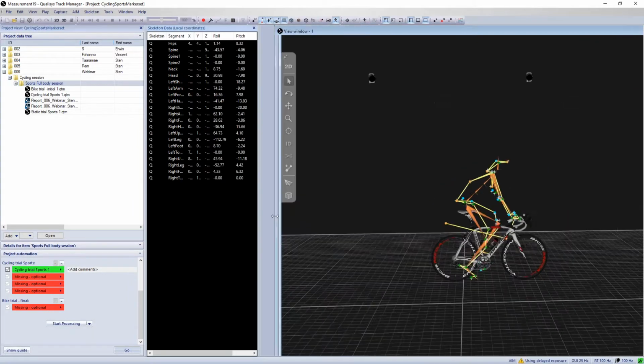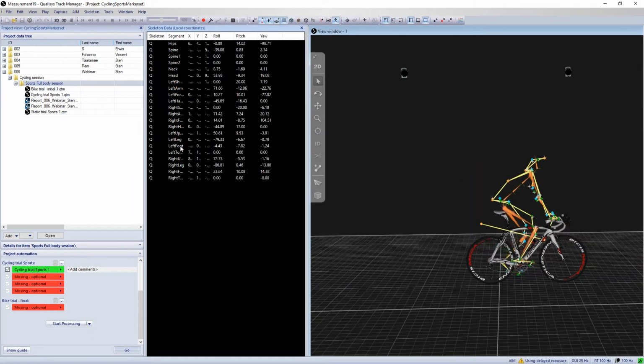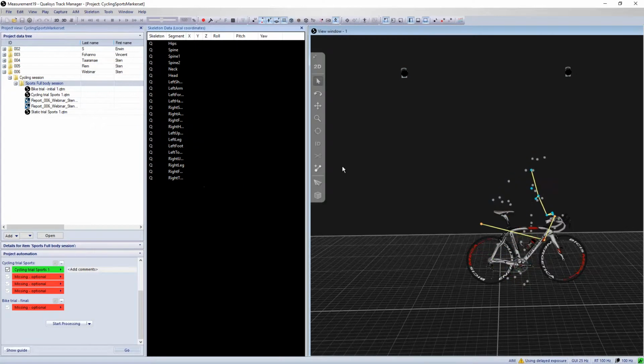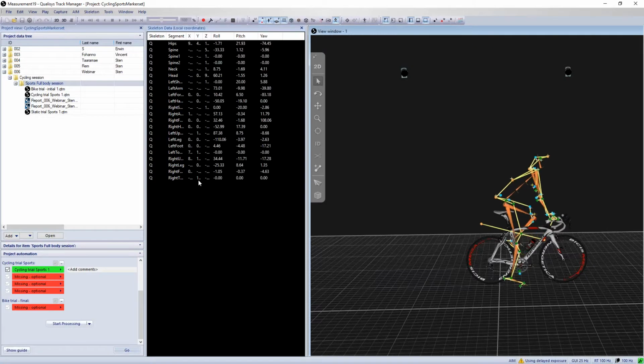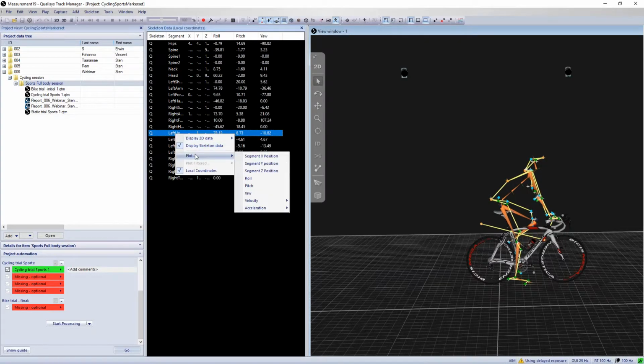and after that, yeah, as you can see, I have the skeleton data, and I have all the segments. So if I ask Stan to stand still, maybe for a while, thank you. So I can have Stan stand still, yeah, don't move. So I'm gonna try to display, for instance, the thigh relative to the pelvis, which is a joint angle. So I can do that in real time. And I want to display, for instance, the flexion extension, which is the roll in our case.